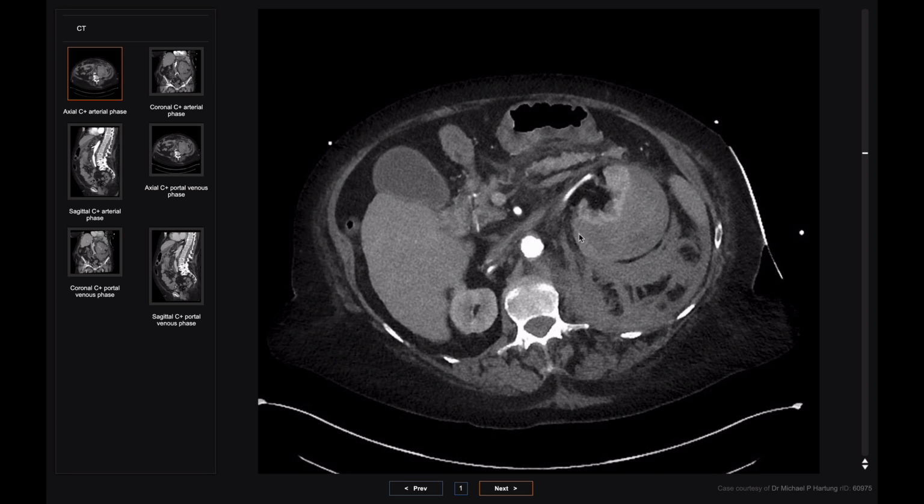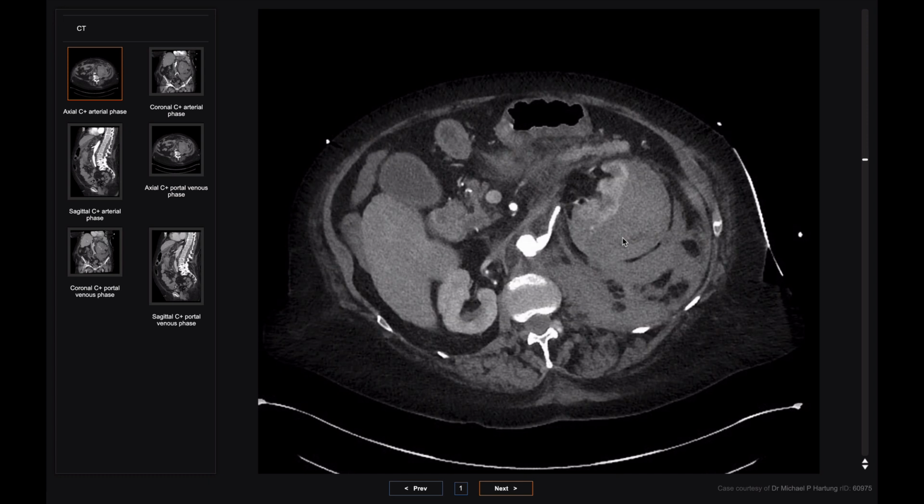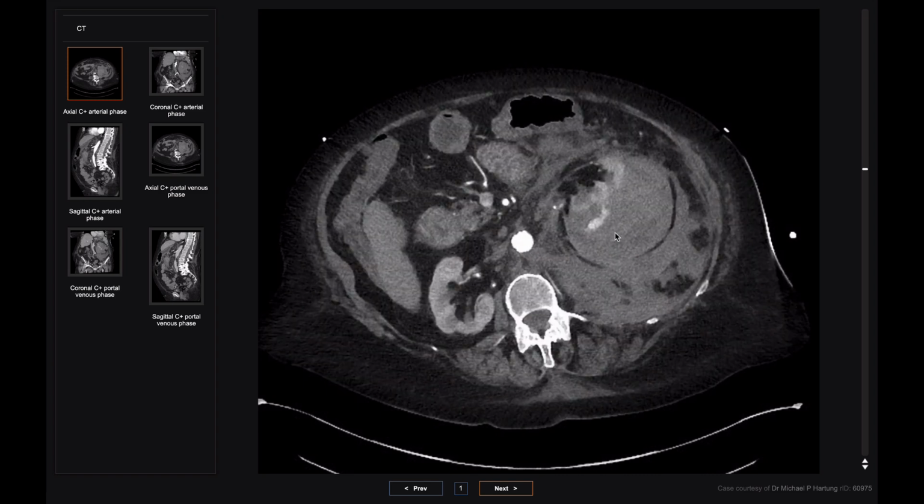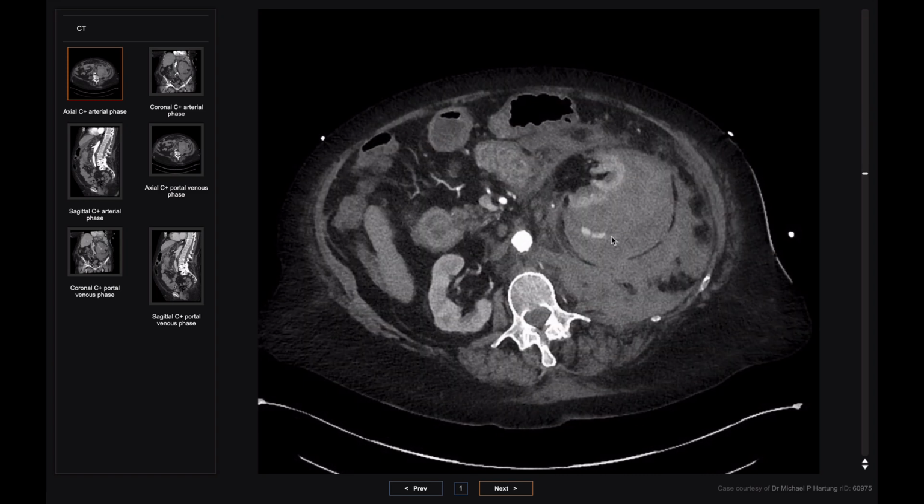displaced anteriorly, because there is a very large hematoma arising from the surface of the kidney, and also there is a lot of blood here behind the perinephric compartment in the retroperitoneum. And what we notice is that there are high density foci of what we call contrast blush, just immediately adjacent to the kidney, just there, and slightly lower down.